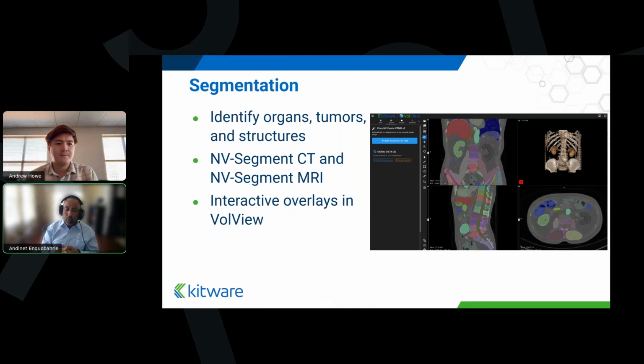So yes, in fact, segmentation is obviously one of the critical pre-processing tasks involved in surgical planning. So yes, VolView will help you in your surgical planning tasks.